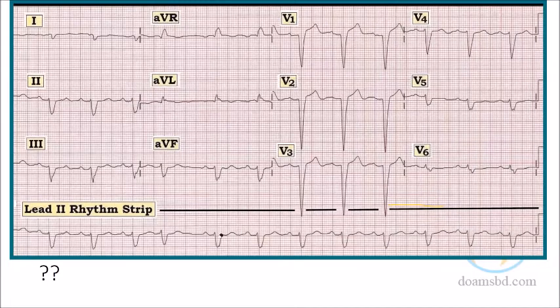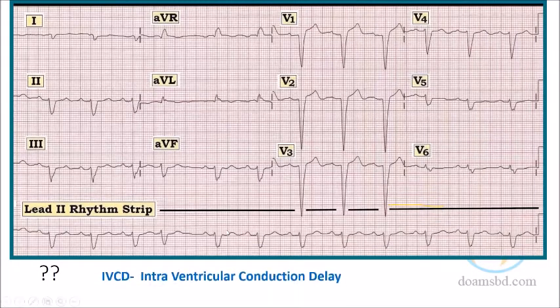Someone answered this is the left block. Let us see. Intraventricular conduction delay or LBBB, which do you want to say, RBBB or LBBB? If we said that there is a fractionation, actually I need to edit it also. Sorry.